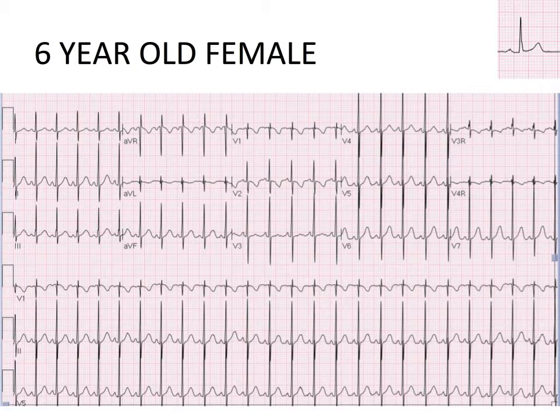You should have found that the only abnormality on this EKG is sinus tachycardia. This patient actually has myocarditis, but it is important to recognize that EKG findings in myocarditis are unreliable. The most common finding is sinus tachycardia, but you may also see PACs or PVCs. We worry about patients with myocarditis because they can quickly develop ventricular arrhythmias.